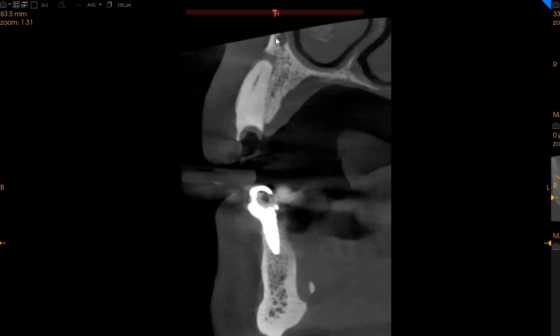This is the canine. The canine has a periapical radiolucency, very deep root if it is extracted. We've got cortical plate perforation, 10 millimeters of width with 19 millimeters of height.